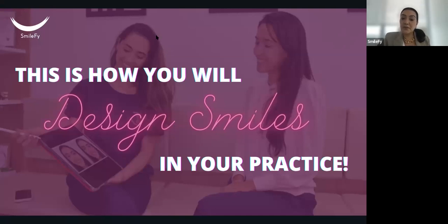So all of you, please, if you have your iPad or your iPhone, or you can use your computer. This is one of the benefits that you can also apply to your office. You can use 3 different devices to do the smile simulation: one iPhone, one iPad, and the MacBook. You can easily mirror this image that you generate on a television or a monitor, if you have a monitor in your chair or in your room. When the treatment coordinator goes to negotiate, you can also mirror the design there, and the patient can actually see what it's going to look like. This is something that you can use.